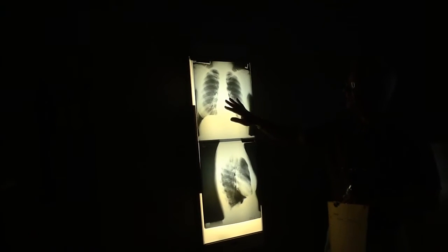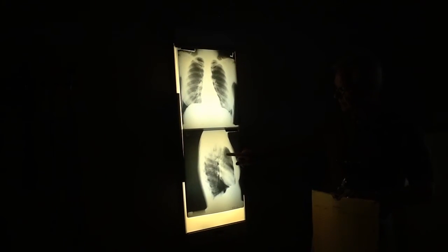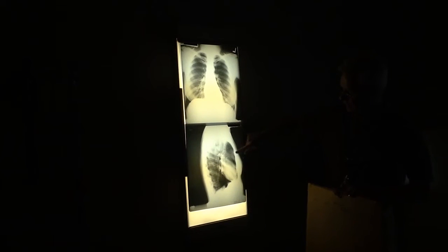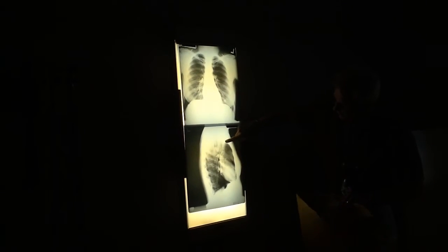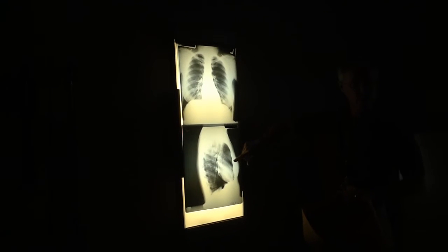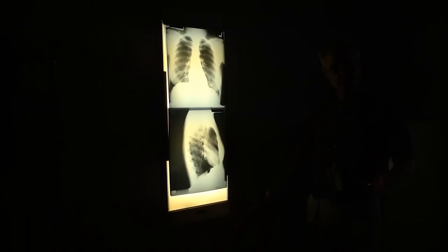Because I don't think there's any widening on this mediastinum, on the frontal. But when you look on the lateral, do you see there's a bit of density right here? There's some water density. This whole area here should kind of look like that or like that, shouldn't it? It should be purely radiolucent. And there is an area of water density in the anterior mediastinum, isn't it?